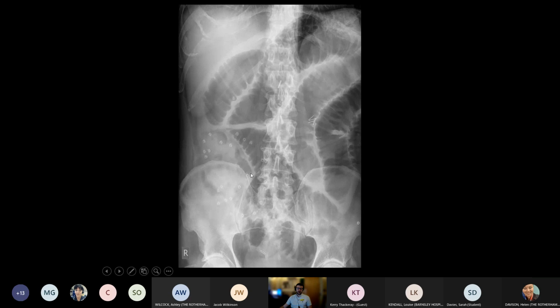These little coil things here are hernia repair mesh. So the patient has had a hernia in the past. This could be secondary to another hernia. It could be due to a tumour or malignancy that's blocked it off, or they may have had recent surgery, with the surgical clips here. They may have had this hernia surgery recently, and it's led to adhesions of the small bowel.